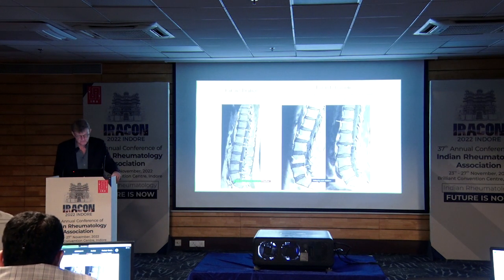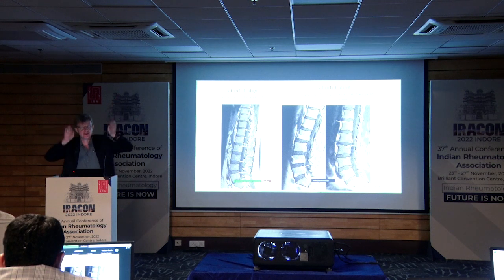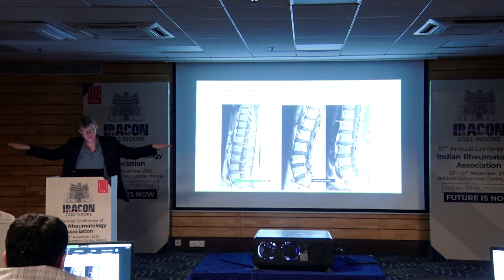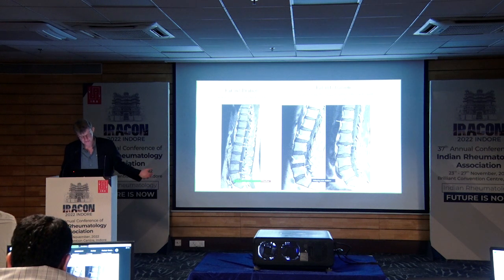This is an example of the typical axial SPA performance, where it's in the corners at the insertion of the entheses. The inflammation has gone away and you have this. They are higher than they are wide in axial SPA, where traditionally in degenerative disease they are more horizontal because it's a disc that is ill. So there you see it more horizontally. So fat is common, not so specific unless there are really many. Typically they're in the corners and not along the disc.